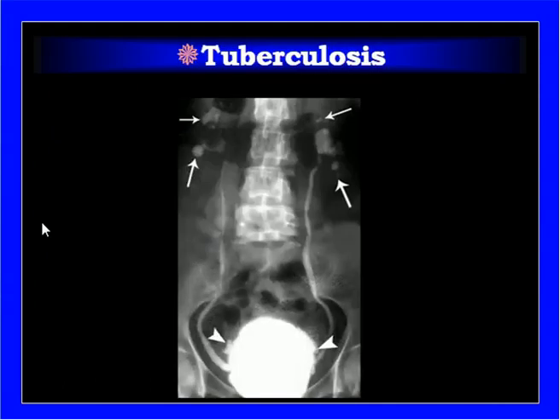Now, various inflammatory conditions can involve the urinary system, which are acute inflammatory conditions, and those are the chronic inflammatory processes like tuberculosis. It's not very uncommon. In this picture you can see the bladder outline is unclear. There are small sacculations, outpouching, and the kidneys are contracted. Ureters are both holding the contrast, indicating that there is some kind of obstruction at the level of the vesico-ureteric junctions.